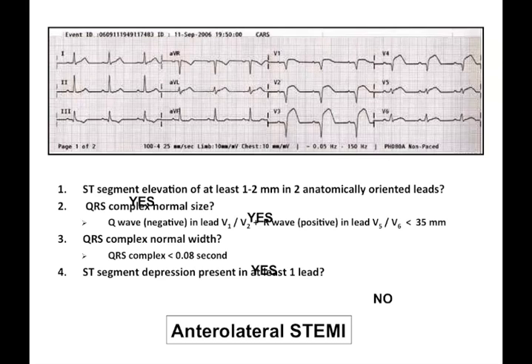Now, if you're a more experienced provider and are comfortable diagnosing STEMI, you can certainly do that here. The value of question 4 helps us rule in STEMI to a very high degree of certainty, but the lack of a positive answer to question 4 doesn't mean that STEMI is not present.